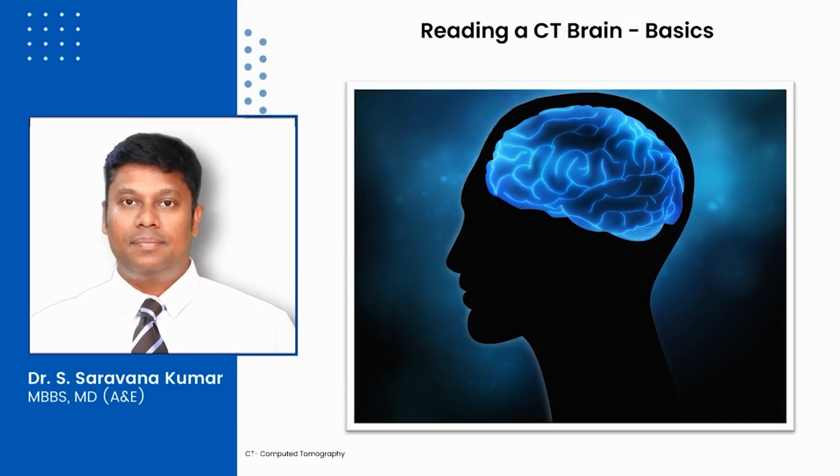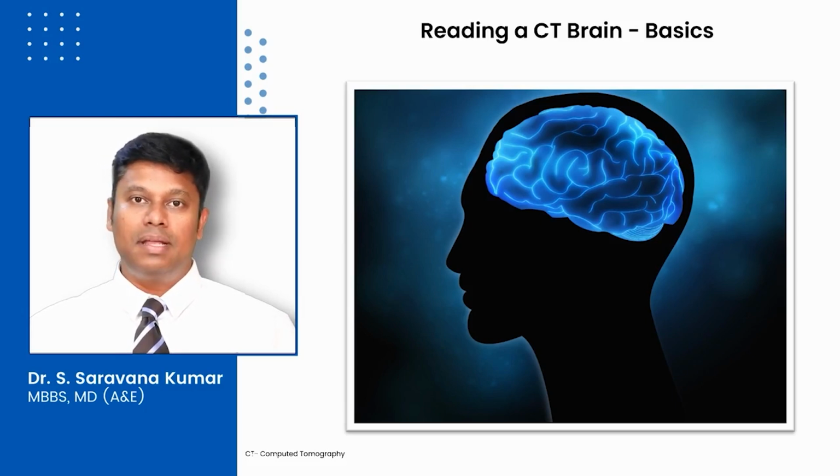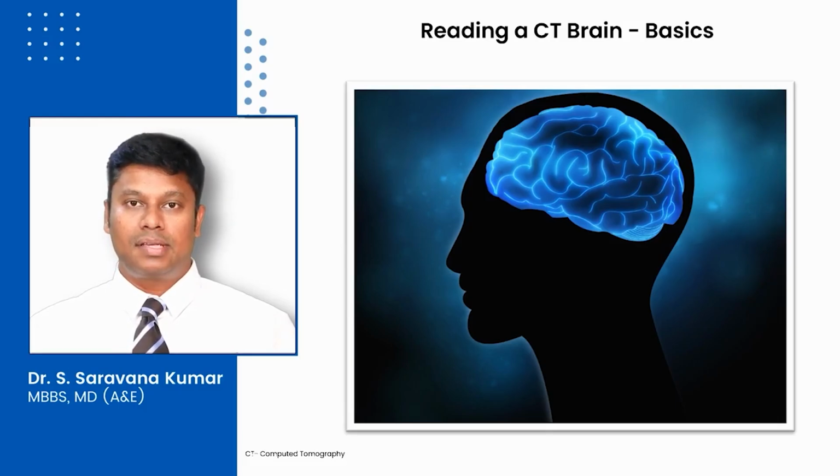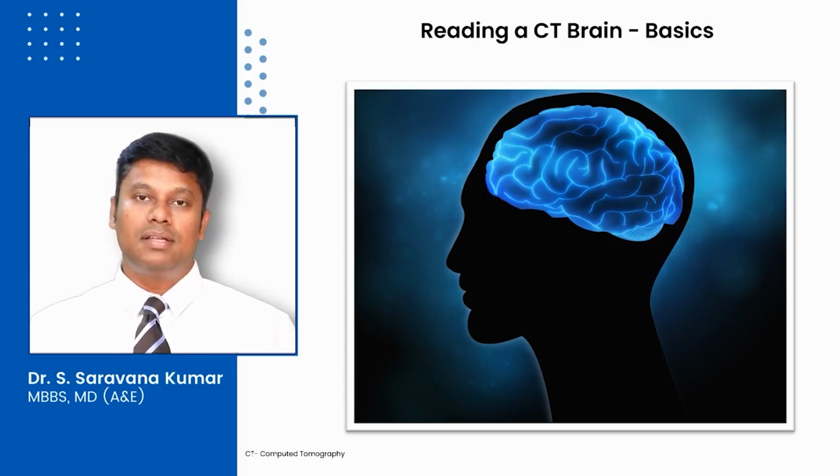Similar to an X-ray or for that matter an ECG, we should develop confidence in reading a CT brain and also report any basic abnormalities. Of course, we are not trying to replace a radiologist here, but what we are trying to learn is some of those basic anatomical regions of the brain and how they appear on a scan and what we should not miss out. So let's have a look at how we read a CT scan.